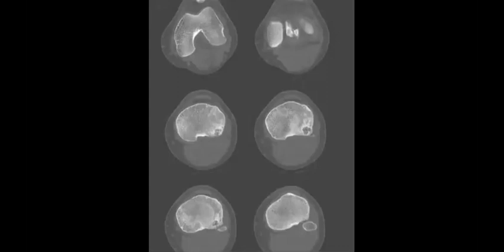and you will put, sure, that the differential diagnosis will be giant cell, maybe, and osteomyelitis as possible differential diagnosis, but the chondroblastoma will be your first top list differential diagnosis, because this is a young patient and it is an epiphyseal lytic lesion, so it will be chondroblastoma as first diagnosis. Okay. So chondroblastoma will be the first differential diagnosis.